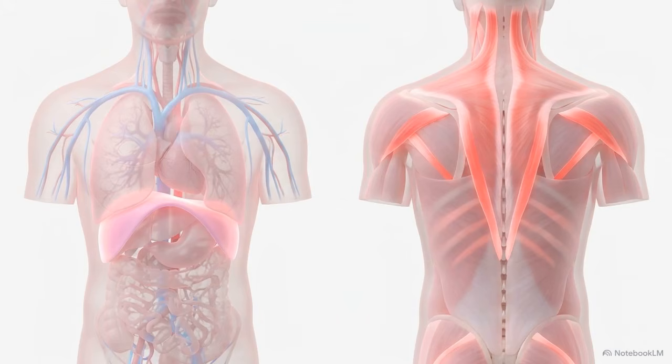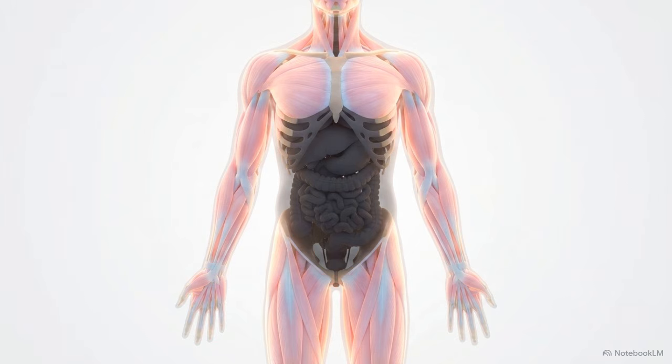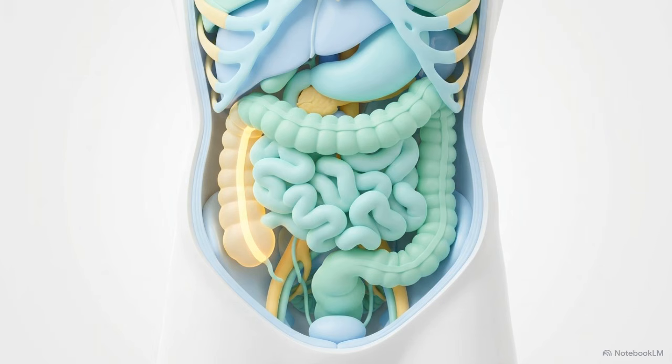Muscles are heavily active sinks. Hyperventilation forces tracer into the diaphragm, while stress-induced tension highlights the trapezius and paraspinal muscles. Insulin administration before the scan stimulates glucose uptake across the body, diverting the radiotracer from the blood pool into global skeletal muscle. Specific organs also act as natural reservoirs.